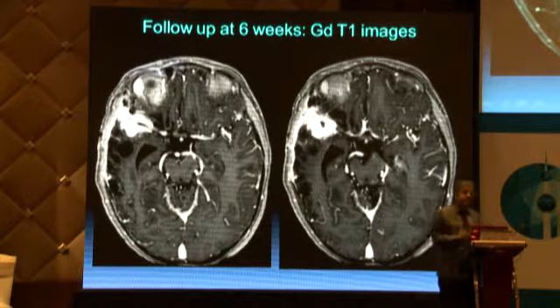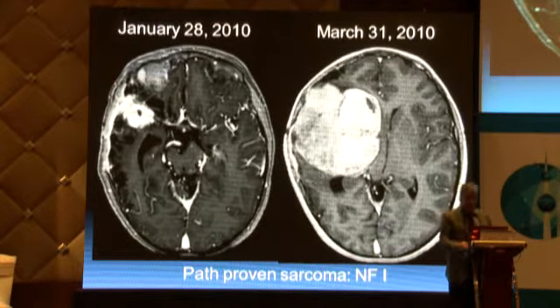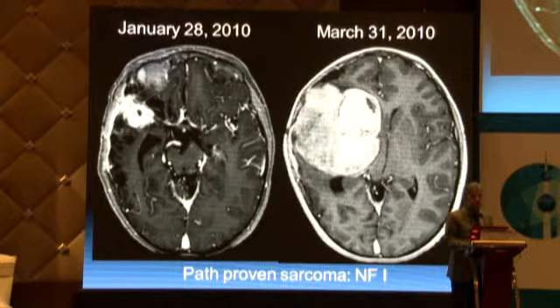So the teaching point over here is whenever you have any phacomatoses, NF1, NF2, tuberous sclerosis, VHL, these are conditions where the tumor suppressor genes have been eradicated or they're no longer present. So all these phacomatoses have a high incidence of weird and unusual tumors. So remember that an occasional enhancing weird lesion in a setting of phacomatosis, always worry about a tumor. So this was a path-proven sarcoma. I've seen 4 such cases like this now, starting off with minimal enhancement. This was more obvious enhancement. And you wonder whether the tumor caused this aneurysm secondary or was it just coincidentally present at the same time. We would never know.